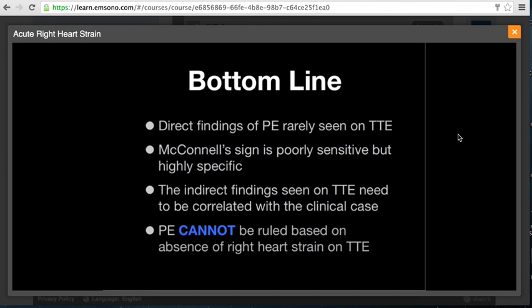What I mean here is a patient who comes in hypotensive but has a history of underlying cardiomyopathy and cor pulmonale, who's found to have a dilated RV and evidence of bowing of the interventricular septum. This patient has multiple reasons for having RV dilatation as well as bowing of the interventricular septum. Could the presence of a McConnell sign be helpful?